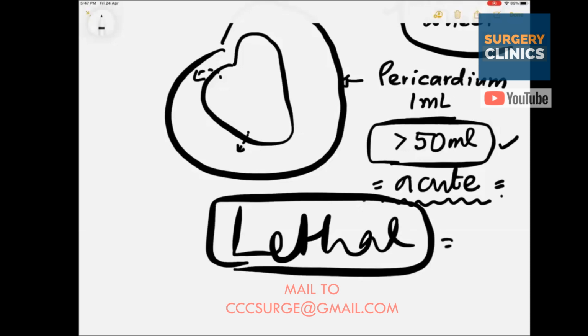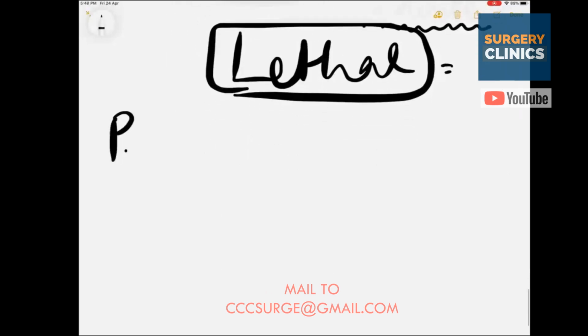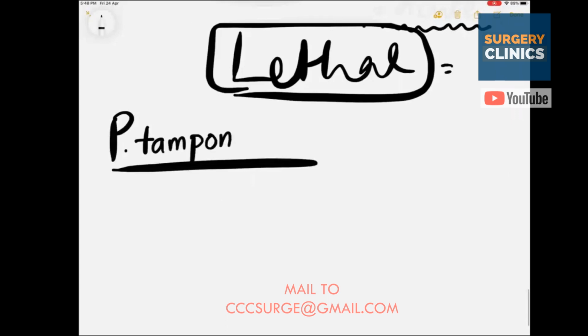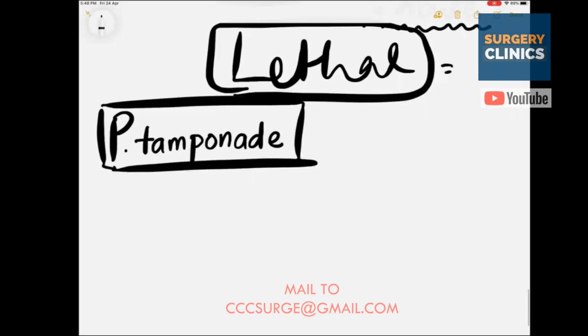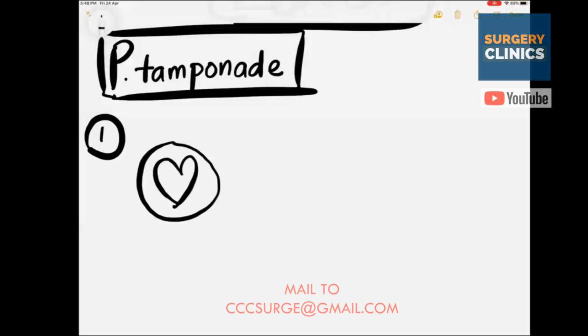Please understand this. Now, what is the main thing about a pericardial tamponade? The main clinical features are: one, as you can see, the heart is not pumping blood, so no blood is coming out.